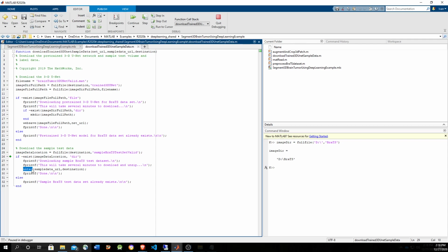This is important. If you get a tar file, which is like a zip file, for training data or test data, you can use this to unzip it. I didn't know that MATLAB had this command, so I downloaded WinZip. You don't have to because you have this.